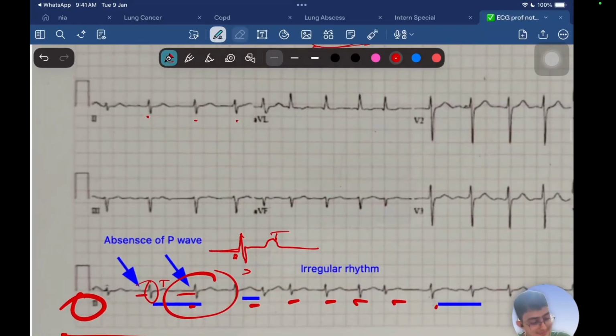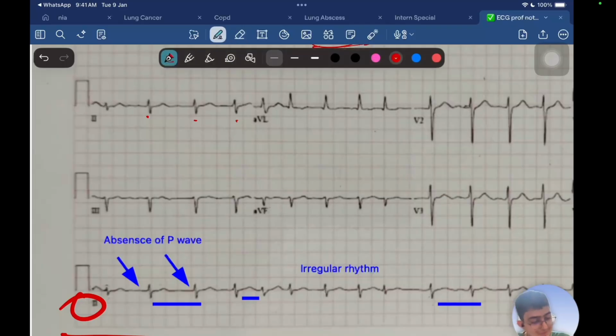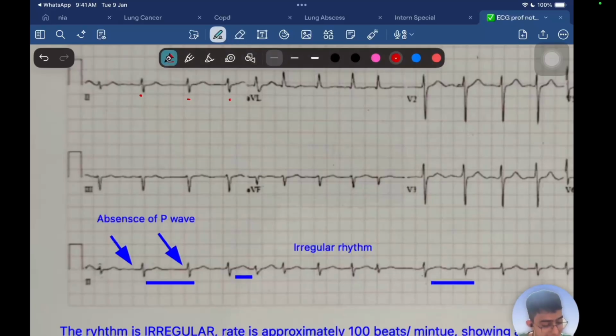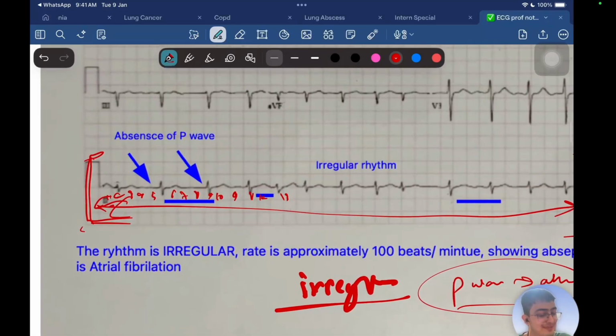The 30 boxes. That's going to be a lot of pain calculating this, but let's approximate. I don't have time to calculate 30 boxes.